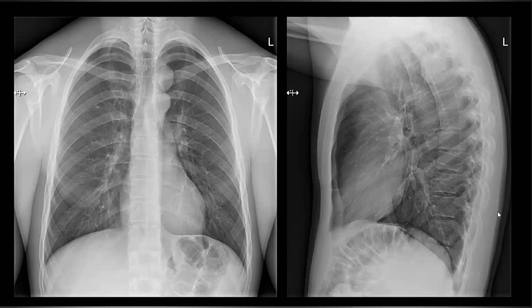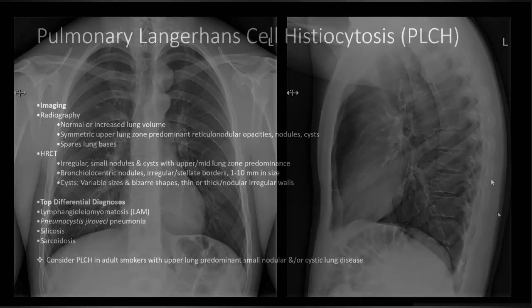I'm looking at the bilateral lung fields. I cannot appreciate any gross evidence of airspace opacification, consolidation, cavitation, or calcification. Bilateral costophrenic angles are unremarkable. Bilateral apices are comparable. Hilar regions normal. No retrocardiac opacity. And next I'm looking at the soft tissues and bones. Those are all normal. Just focus on the opacity that you saw. You're absolutely right.